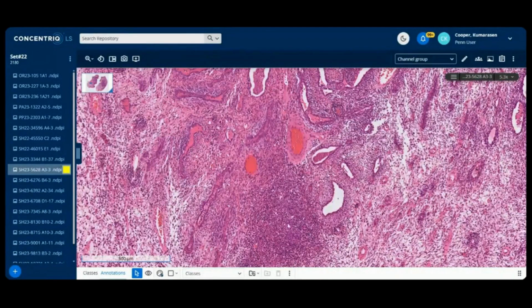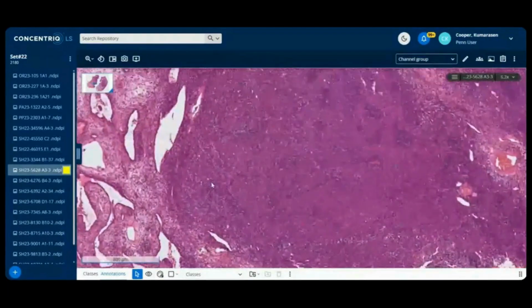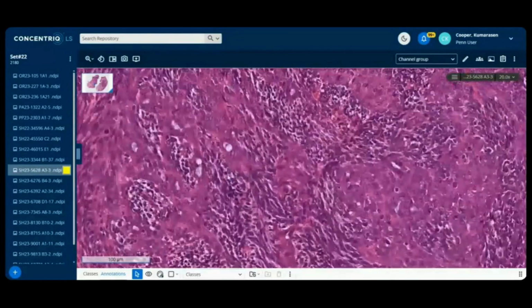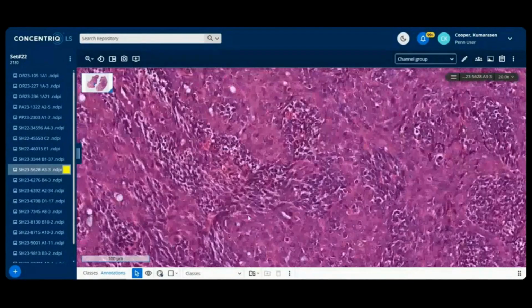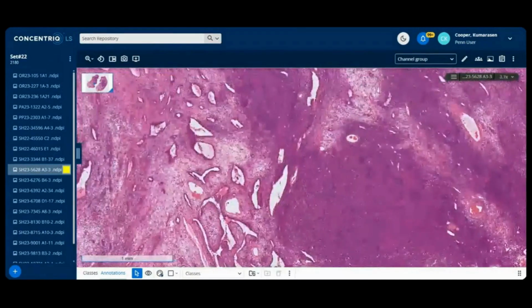Then I just want to go to the cellular areas, and I'll come back to these areas. But the cellular areas you can see here, very hypercellular. And I hope you can see this because it's quite dark, and I'm wondering whether the section was a little thick. But you can see these spindle cells, clearly hyperchromatic spindle cells, and this background of somewhat more round to epithelioid cells as well. Okay, so that's the hypercellular areas.